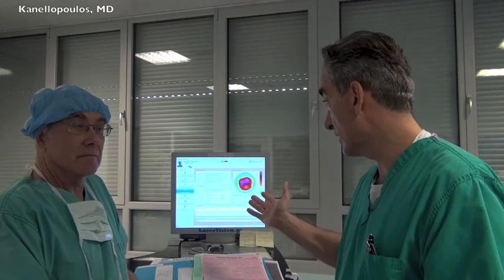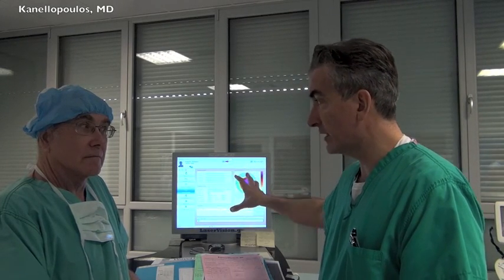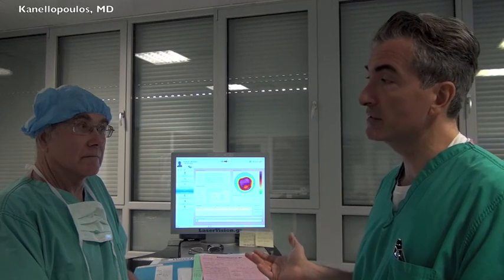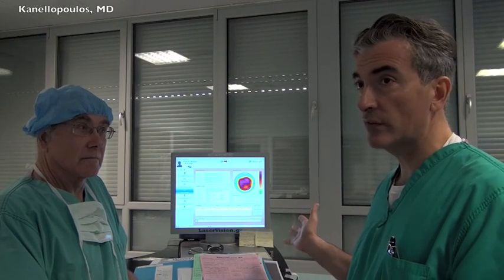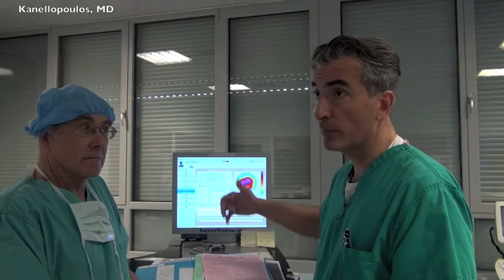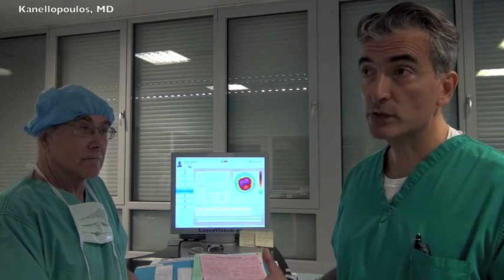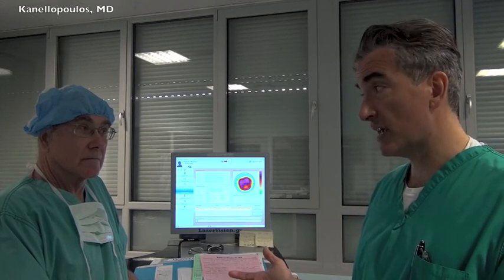And then again, these are such dramatic changes within the cornea that they may hold a refractive surprise. We think we're treating a refractive error here, but I wouldn't be surprised if this case ended up being a +1.5 or a -1.5, which would be considered in normal refractive surgery a disaster.